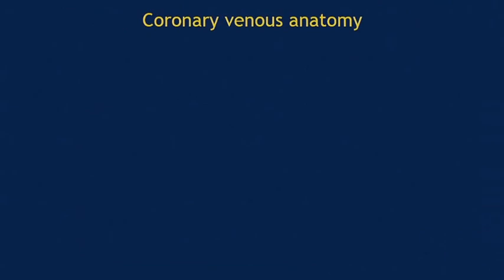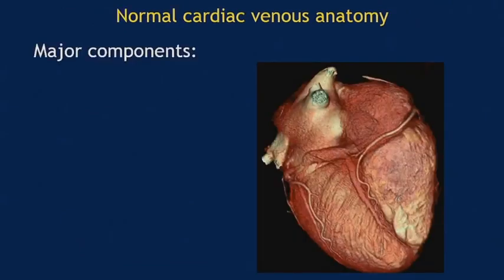The last part of my talk is coronary venous anatomy. And I want to talk about a few key aspects of the venous anatomy. So there are various components to it.